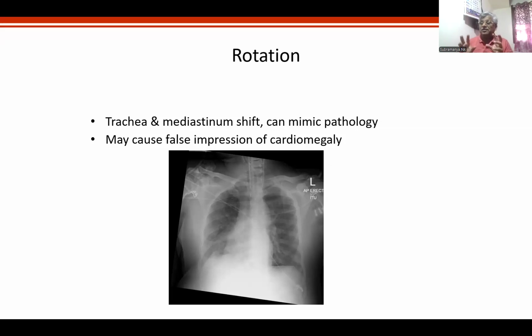Whether it's hilar adenopathy, prominent hilum, less prominent hilum, is there a node? Do you all agree? Hilum is a graveyard. Please don't say no. Definitely it is a graveyard for all of us. A lot of problems we have in and around hilum. If you take trachea, it's fine, lungs fine, cardia fine, borders fine. It's not a difficult situation. Whenever you come to hilum, that's the area. Today I'll spend another 10 minutes extra on hilum. If all of you say yes at the end, I will give you perfect interpretation.